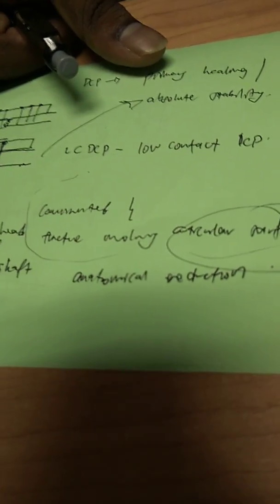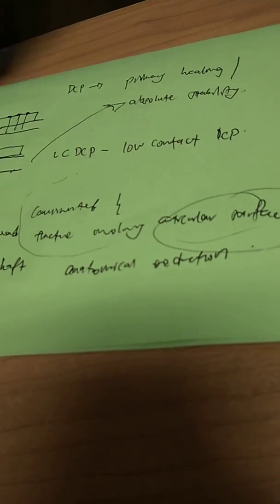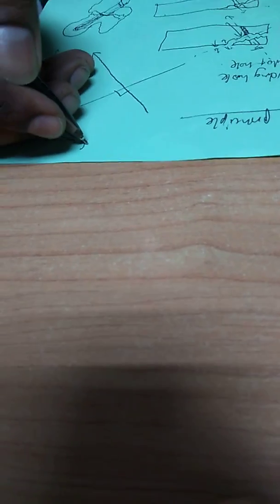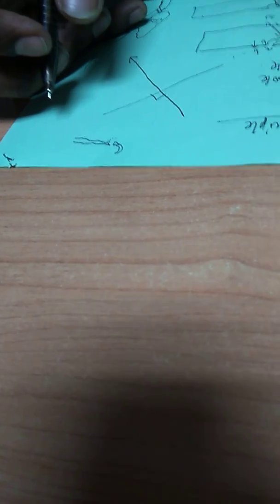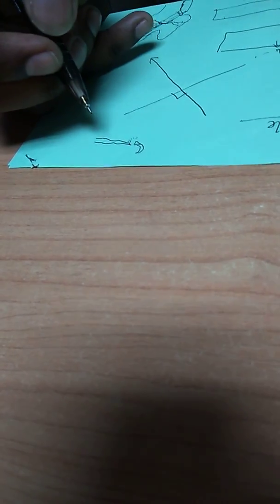Unless you have cases like soft tissue injury. For example, cases of AC joint disruption. So this is your clavicle. This is your acromion process. So there's disruption here. Normally the disruption is caused by the tear of your coracoclavicular ligament, the CC ligament. If your CC ligament is torn, every time you lift up your hand, you have a lot of pain there at the AC joint.